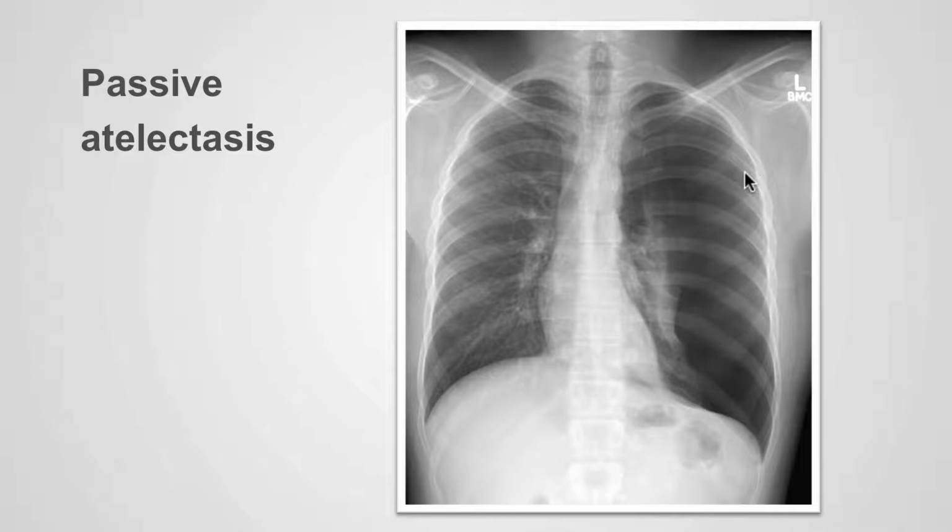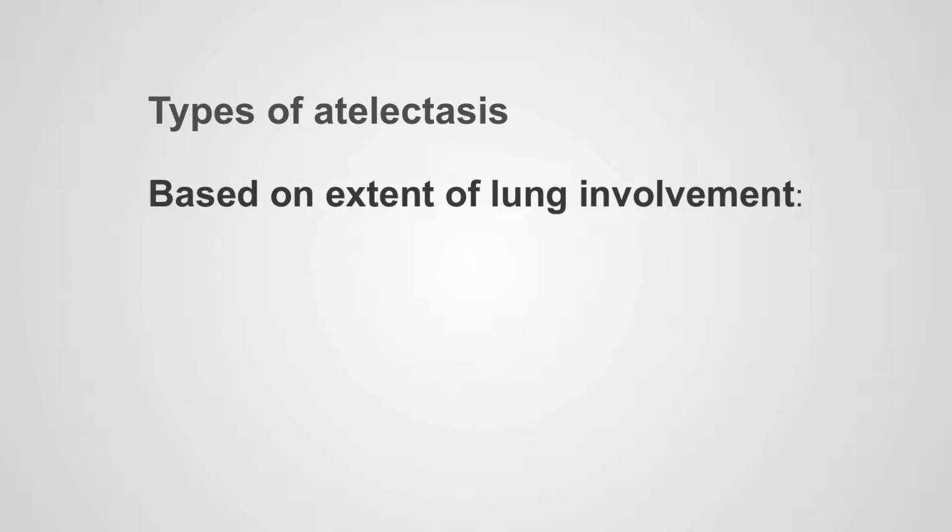The elastic properties of the lungs are preserved, and therefore the lungs relax or recoil, which results in the loss of volume. A pleural effusion will cause more atelectasis in the lower lung zones, whereas the upper lung zones are more typically affected by a pneumothorax. In this case, we see a tension pneumothorax that is causing significant collapse of the left lung as well as mediastinal shift.